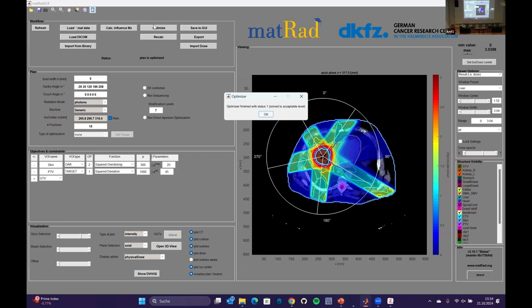So yeah, this is also an option. For protons, it's also interesting, but the problem is that to optimize beams, you also need to calculate a lot of beams, which just makes it slow. Okay. So here we saw some change of the beams.